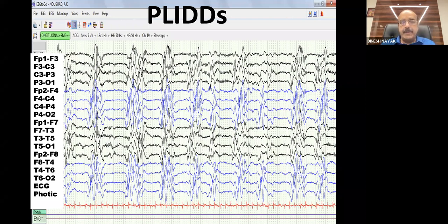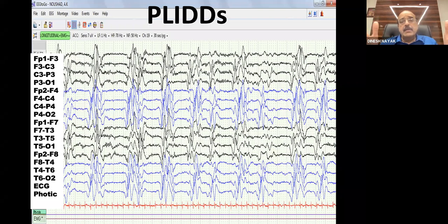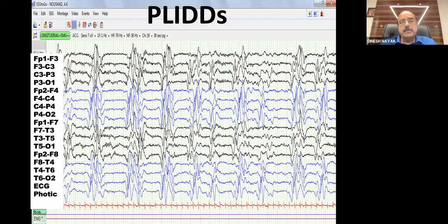And you saw the myoclonus of post-anoxic damage, which is a rapid myoclonus. You saw the slow myoclonus of SSPE. And then you saw the continuum between periodic discharge and the continuous, which evolves into continuous activity, then again evolves into periodic. So periodic, continuous, periodic, that relationship between excitation and inhibition. When the inhibitory mechanism takes over, it becomes discontinuous. So that's what it is.